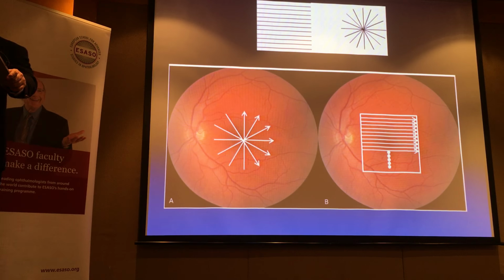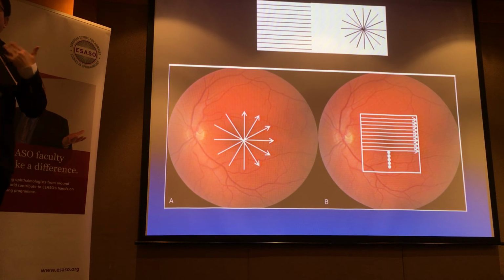As I was sharing over tea, I think it's important that you base it on your clinical decision, because you are answerable for that. Last point I'll make, besides the scans, you can also vary the width of the scans, meaning that this is probably about 20 by 20 degrees, or you can potentially go wider, or if you really want to concentrate on only one small area, you can even narrow the scan, right? But realize that if you have a wider area, if you have closer spaced scans, each of these will add to your acquisition time, which can make the patient get tired.